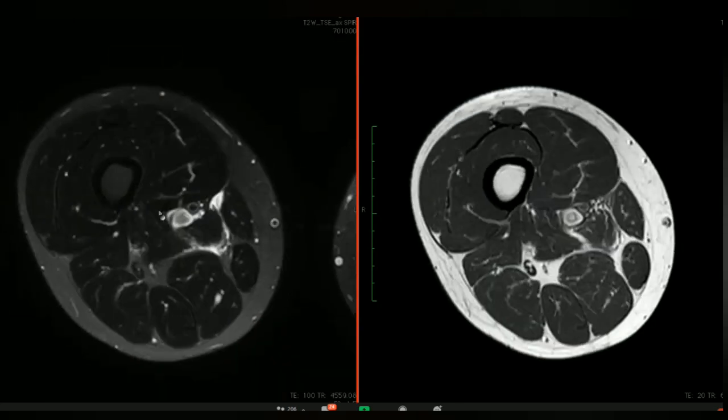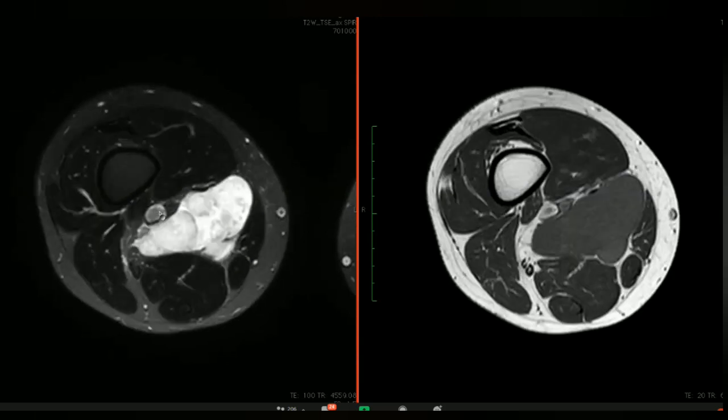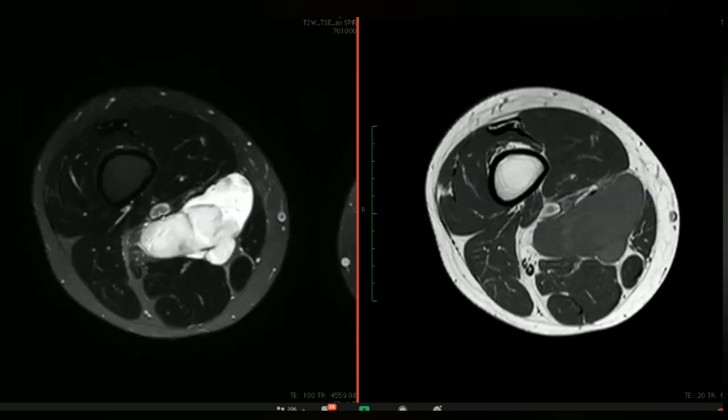Sir, first of all, what do you think it is? Is it aggressive? Is it benign? Question: is it solid? Is it liquid? That's question number two. Or actually, let's reverse the question. Question number one: is it solid or liquid? Sir, it is solid. Good. It is solid.